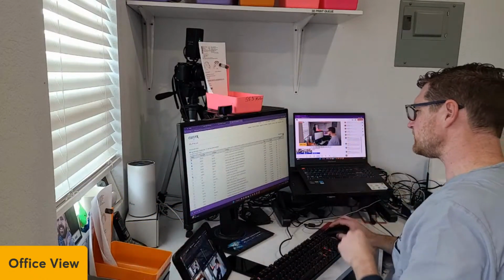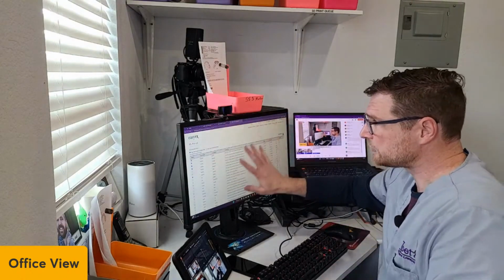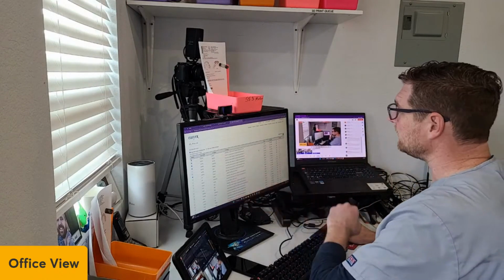Okay, so here is the beautiful part of this. When you activate it, it'll download something that you have to install. I forgot, you saw that download there and I just cleared it. You have to actually install that the first time. I've already installed it, so it should work. But you have to install it first for your EasyRx web browser to talk to your Preform or your nesting software that EasyRx integrates with. So that's why that thing downloaded. And I've already downloaded it for another browser.